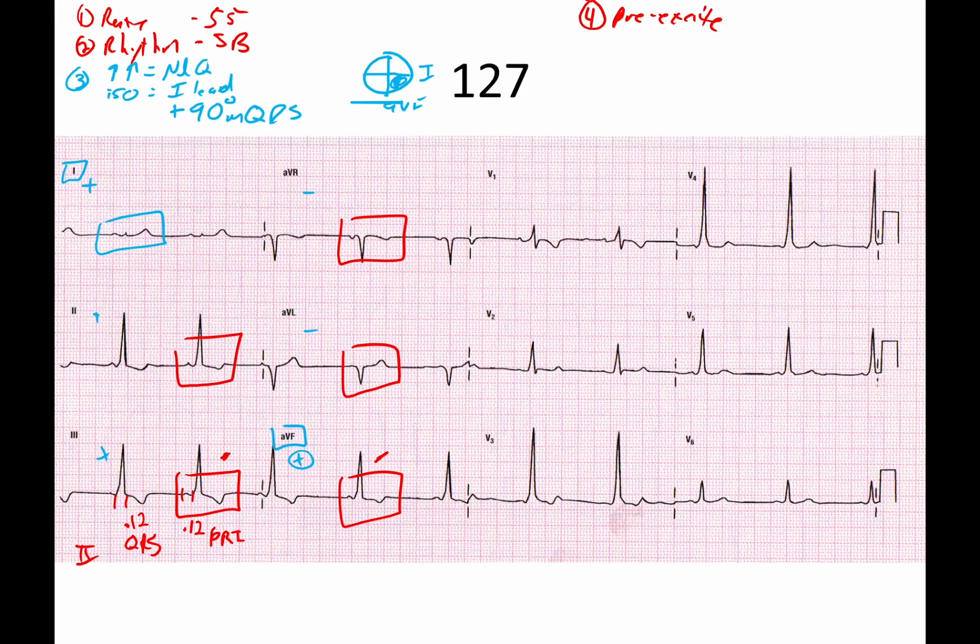And so the short side of the PRI, the wider QRS, presence of what appears to be a delta wave, add in a little symptomatics. Like I said, if it's a kid or maybe they came in with some tachycardias that we didn't know why, syncope, whatever that may be. Those are reasons to start suspecting that kind of stuff. So I'll go ahead and say yes to that.